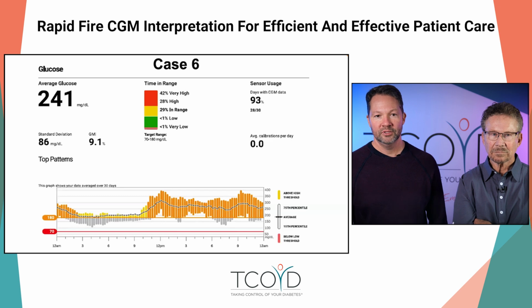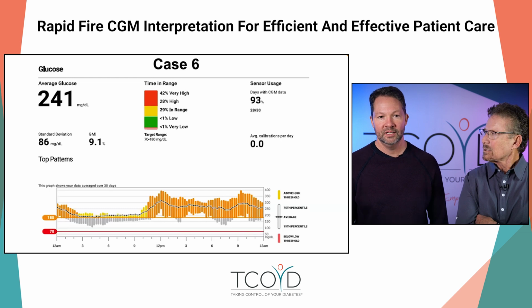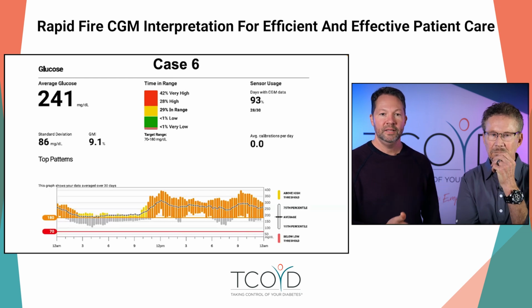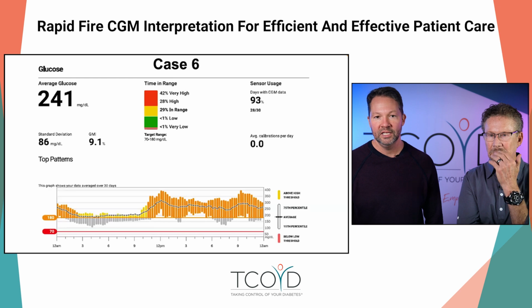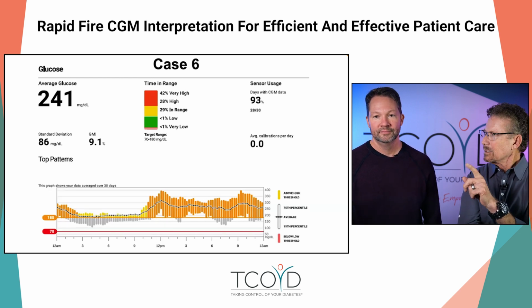No matter what, this person's not getting enough insulin. So if they're on a pump, the basal rate's not high enough, the correction factor is not aggressive enough at night. They might be kind of trying to maintain high blood sugars, like I was saying before, bad problems with lows. Not bolusing, maybe not even at all for meals. Just start with dinner, right? Just start with dinner, yeah.